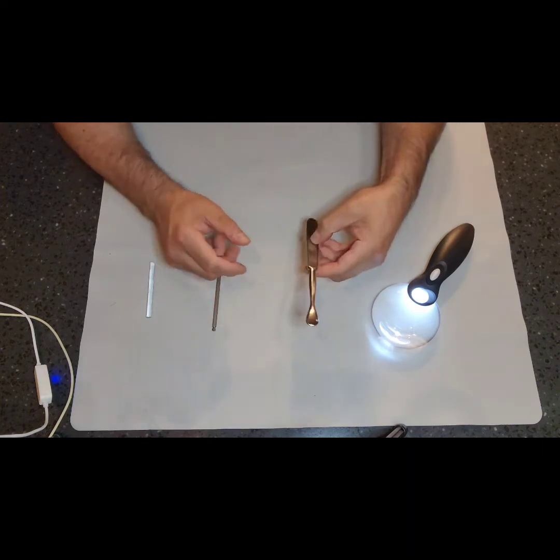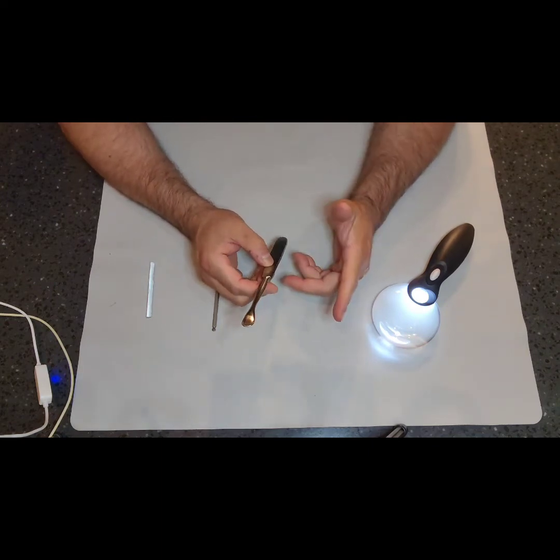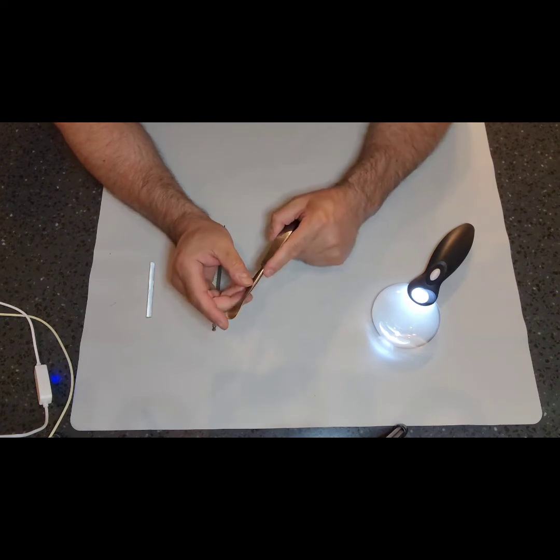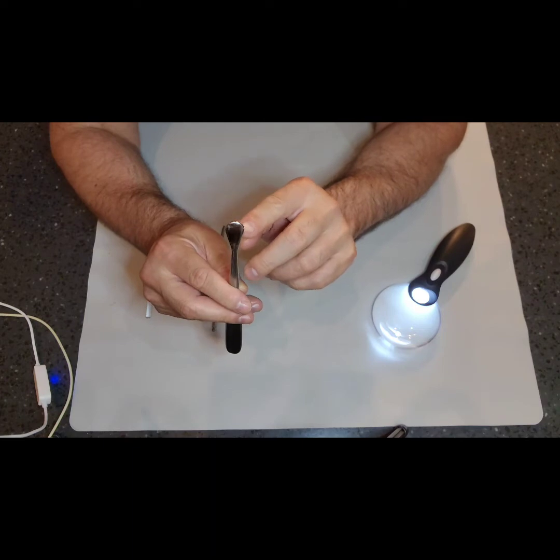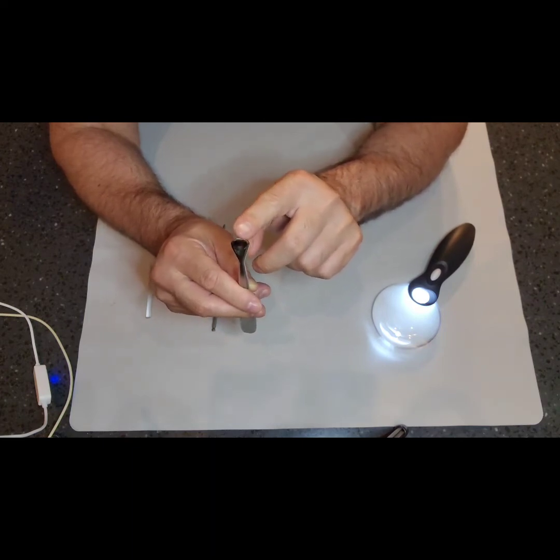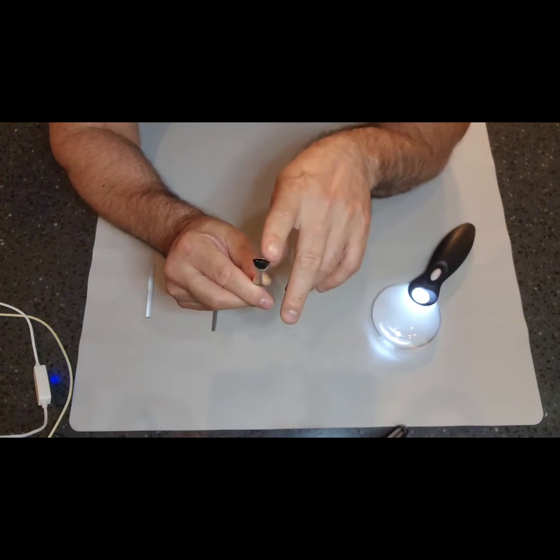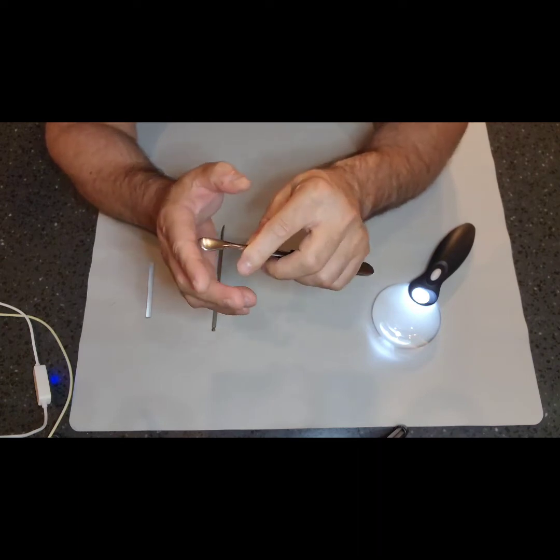Okay, for larger elevators, again, that are one piece, there's no soldering or any welding, so you're looking for damages in the instruments, heavy scratching, heavy dents around the elevator itself, right? Whether it's round, oval, curved, straight, you want to make sure that that is a very smooth edge. And most elevators are sharp, guys. It has a sharp edge on it. Okay, it's not sharp like a knife where it's gonna cut easily, but it is sharp enough that it can cut you.